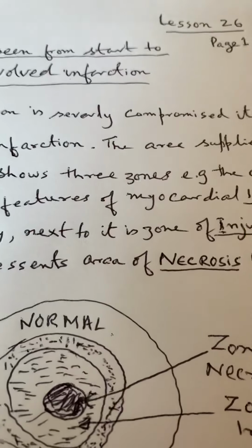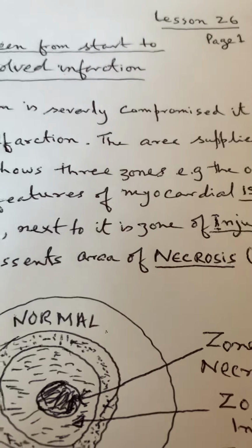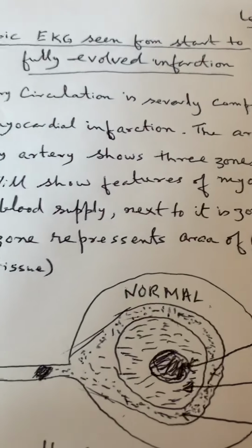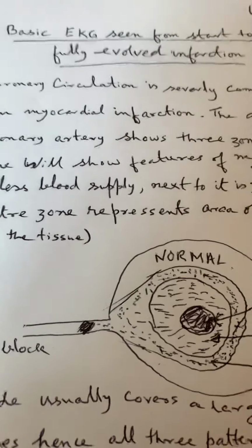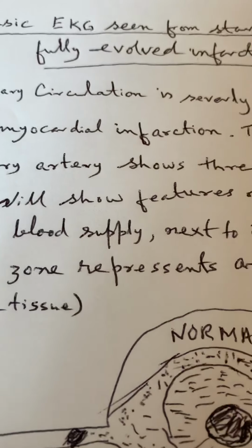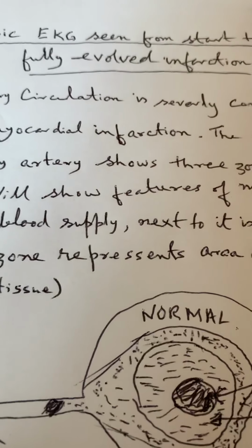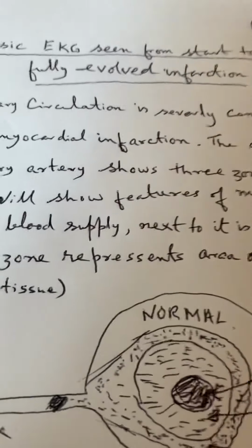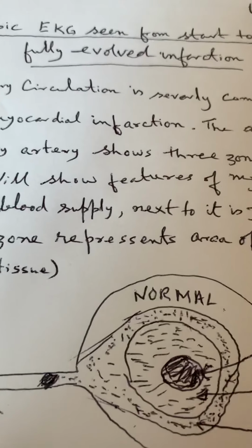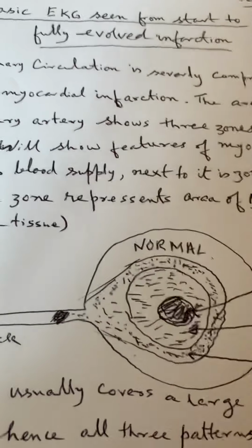This is our 26th lesson, and this is page 1 of this lesson. Here we are going to discuss the basic EKG seen from a start to fully evolved infarction.